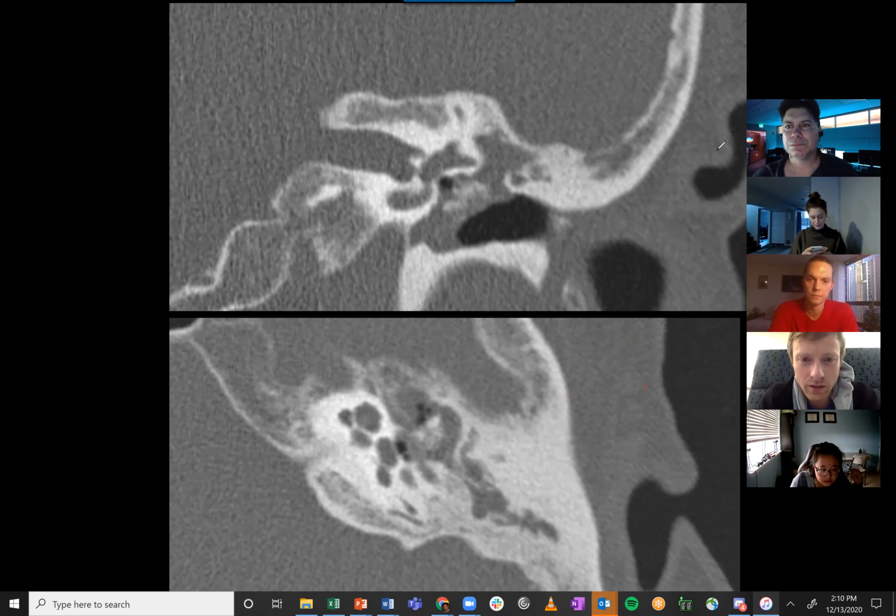Right. So I'm thinking about, additionally, there's also opacification of the mastoid air cells. So I'm thinking about an infectious process. Yeah, long-term infection in the middle ear cavity sometimes has calcifications that are laid down on the ossicles. Sometimes you see thickening of the TM.